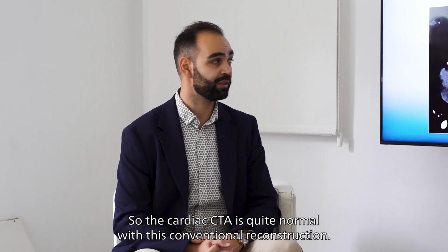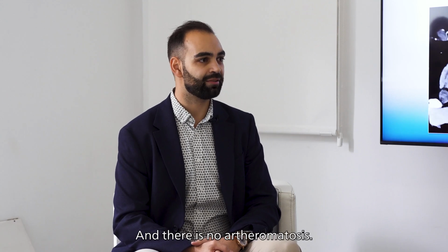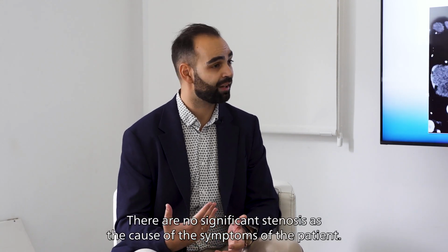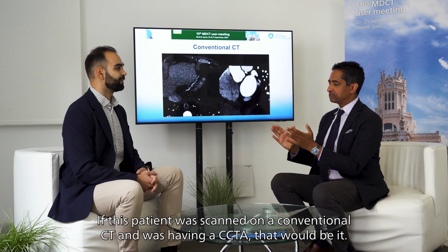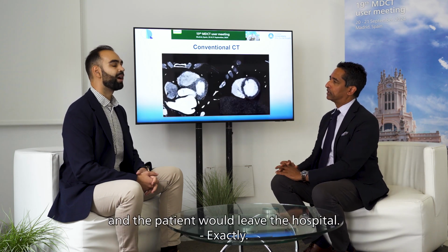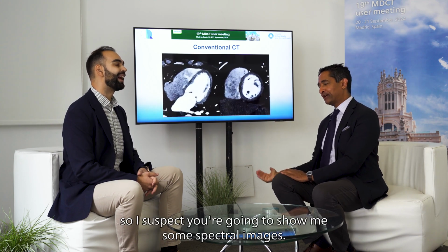So the cardiac CTA is quite normal. Within this conventional reconstruction, we can check out the coronary arteries, and there is no atheromatosis, there are no significant stenosis as the cause of the symptoms of the patient. Now, if this patient was scanned on a conventional CT and was having a CCTA, that would be it. No evidence for coronary stenosis, and the patient would leave the hospital. Exactly. But you did this on a spectral, so I suspect you're going to show me some spectral images then.